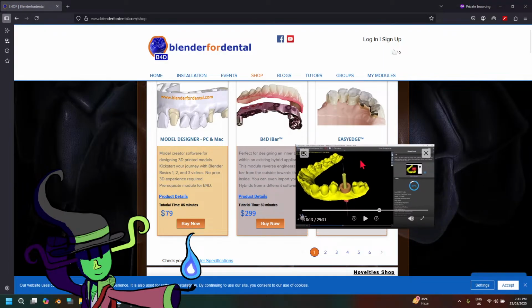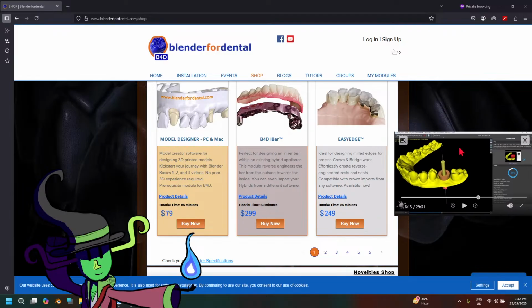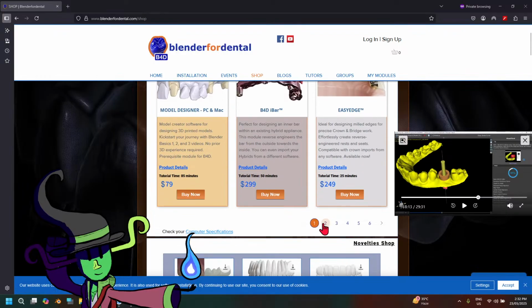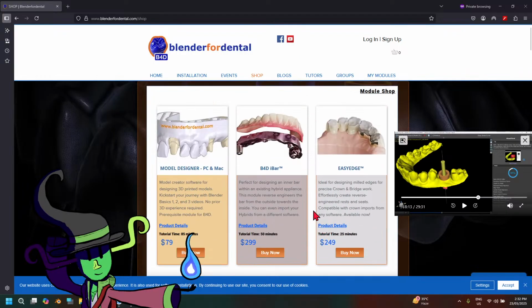It's very complicated, I must say, but once you get the hang of it, you get to see how good Blender for Dental really is.